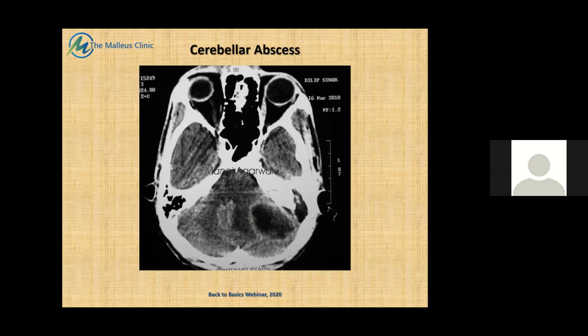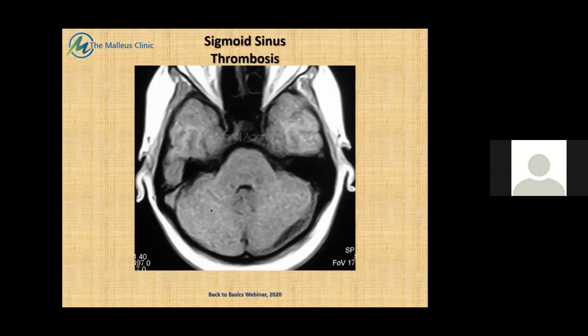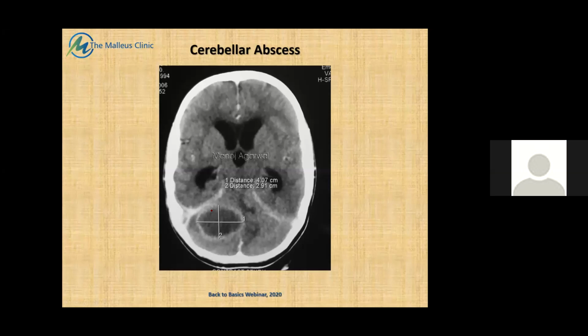Okay, so cerebellar abscess. Another example of a cerebellar abscess, a little above, which is on the right side of the patient. Okay, so cerebellar abscess is an important complication that has to be kept in mind.